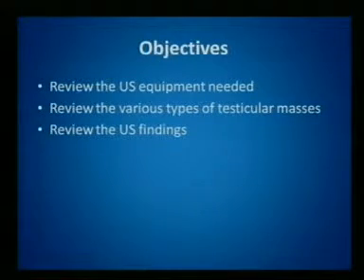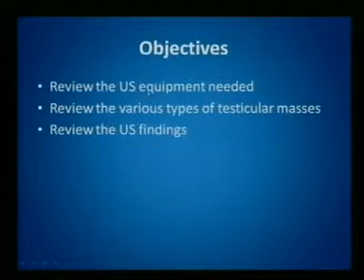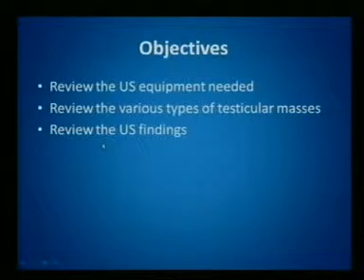Bismillah ar-Rahman ar-Rahim. My objective is to review some of the needed equipment in the ultrasound used in scrotal imaging, and review various types of testicular masses, and review the ultrasound of these findings of the testicular masses.